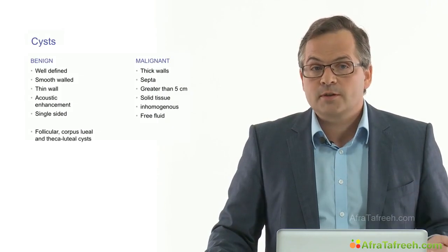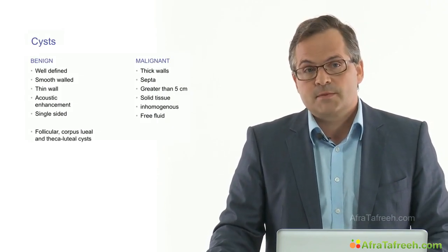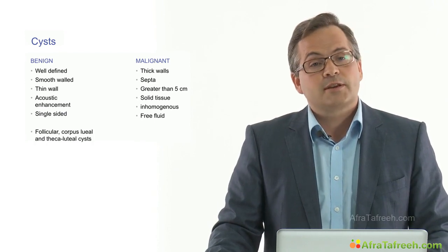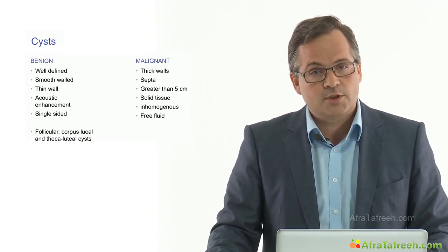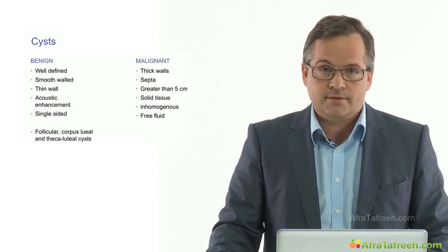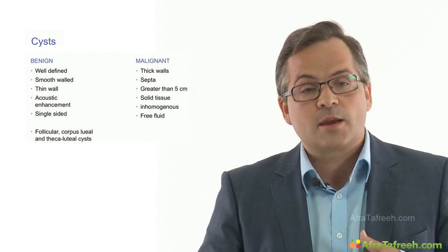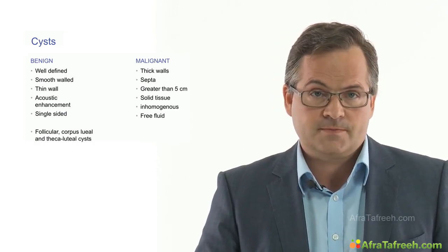The most common and most important findings related to the ovaries are cysts. It is essential that these cysts be examined by means of transvaginal sonography, and there are definitive schedules which describe the procedure that has to be done then. But I'm not going to describe this in detail here. An exact identification of a malignant tumor by means of transabdominal sonography is not possible in the case of cysts.